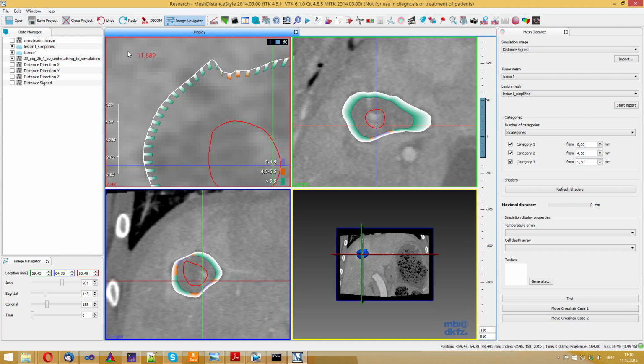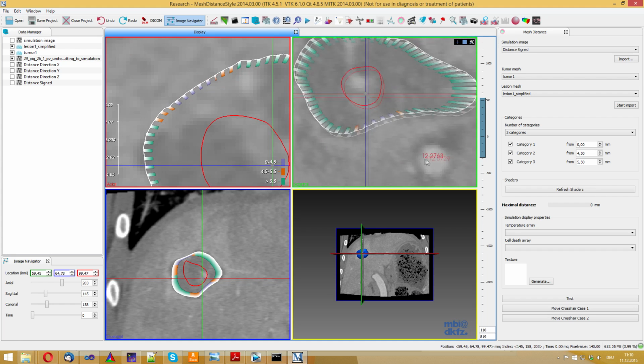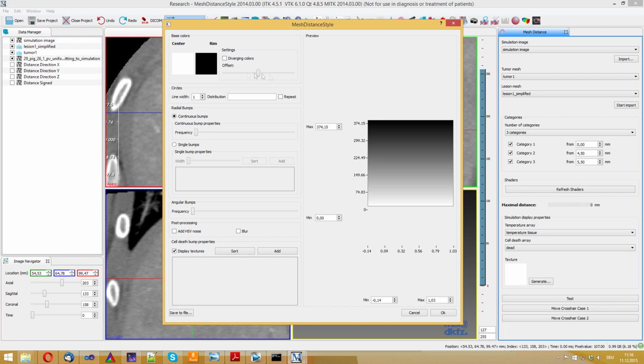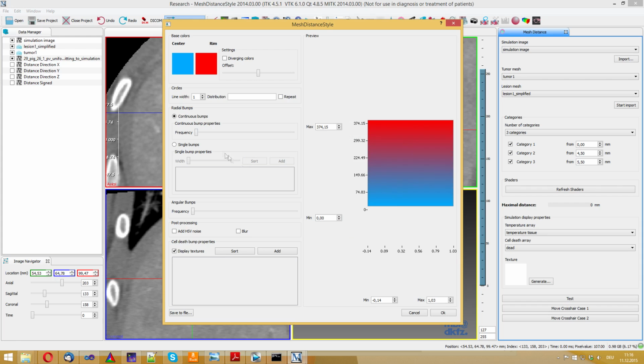representation and unblock the view on the underlying patient data. Using this approach, the user can easily evaluate treatment success by simply scrolling through a single slice deck once. In case the result of simulation does not conform to required quality criteria, the user can start an analysis in stage 2. Here, the user can add one scalar field from simulation to the visualization.